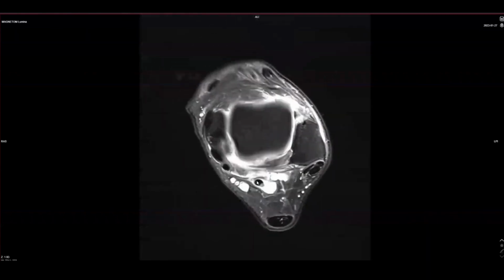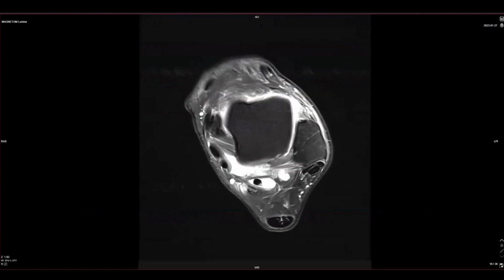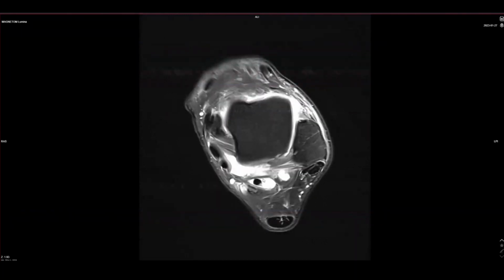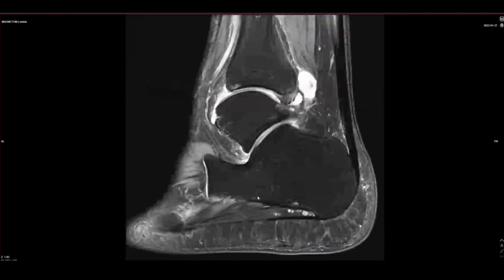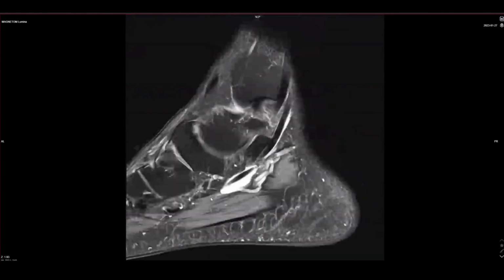The patient also has FHL tenosynovitis, which is typical along these patients, I feel, that have this posterior PTFL thickening, sprain and synovitis, chronic and high grade over time. This is a decompression of the synovitis in the joint through the FHL, and I usually give them some kind of measurement when it's extending through Henry's knot. Like in this here, I will tell them that tenosynovitis extends over that, just to hit it home that there's a lot of it.